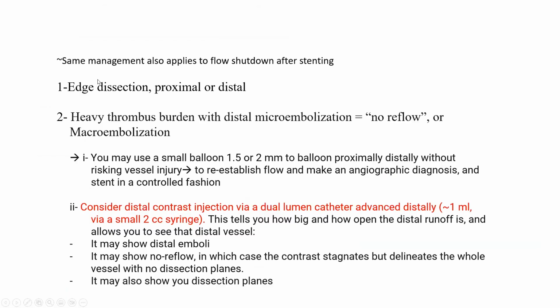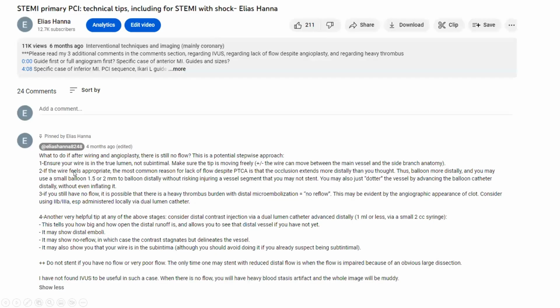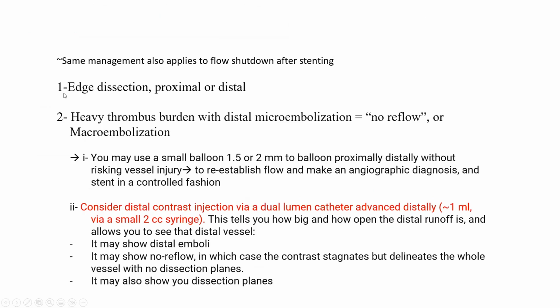So there are 2 major differential diagnoses, and the management strategy is similar to having no flow after wiring and angioplasty in STEMI. So 2 major differentials: edge dissection, proximal or distal, or heavy thrombus burden with distal microembolization, no reflow, or macro embolization into major branches.